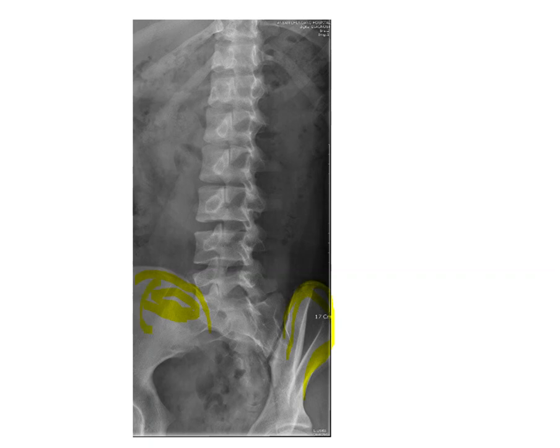So that tells me that the patient is lying with their right side down on the table, and their right ilium is being elongated. All right, so now this also tells me that we're going to be looking at structures on the right side of the lumbar vertebra for this image specifically.